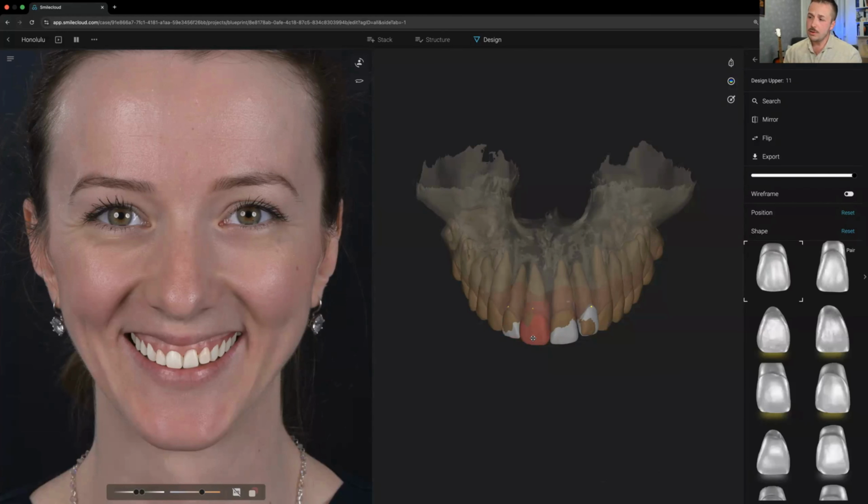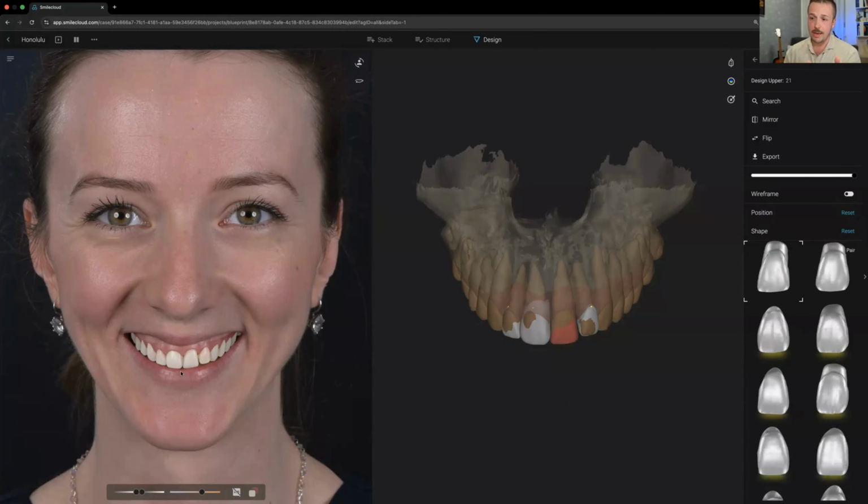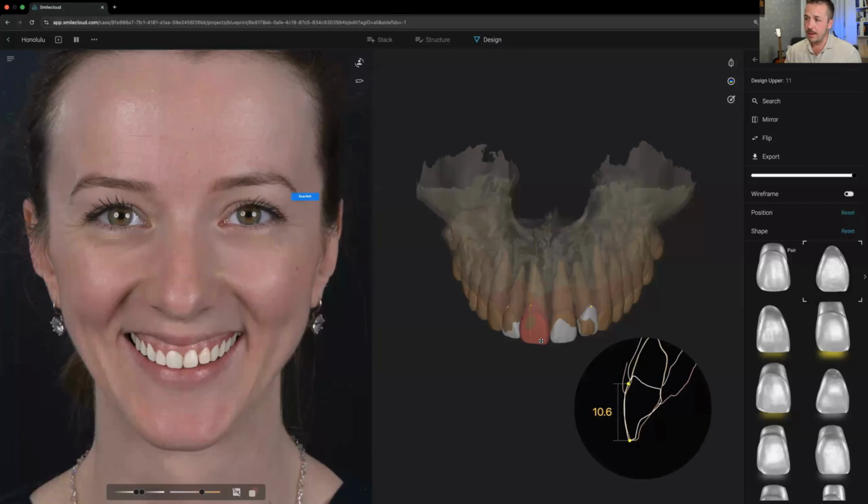So what I want to achieve here is more symmetrical proportions of the teeth, but looking at her lower lip, I don't have much room to elongate them anymore. So I have to maybe address the cervical part or do a little bit of crown lengthening. So in this case, we were discussing doing crown lengthening, and there was a way I could show her why it was necessary.